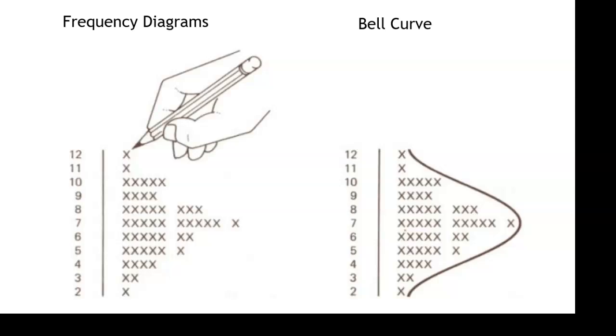Hi, in this video we're going to be discussing Dawn's target range settings. These are the settings that determine whether Dawn suggests a dose change, how big that dose change is, and how long a next test interval Dawn recommends.